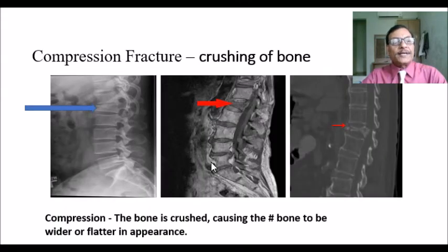So there could be a case of compression fracture that we have to recognize sometimes, especially seen in vertebra. So here you can see the height of the vertebra. Here it is different, one is lower, and this has been shortened. So there is a fracture here, with short height.